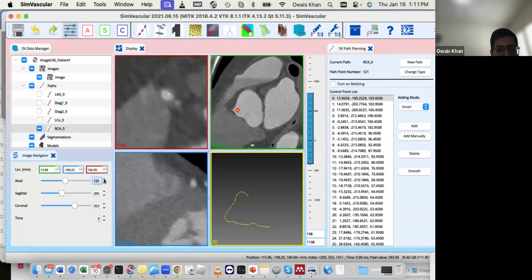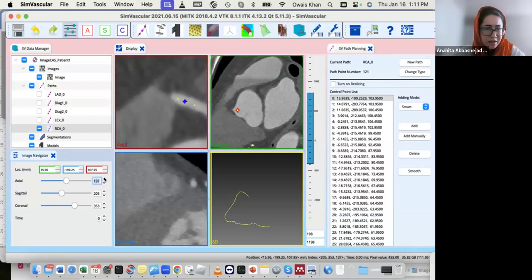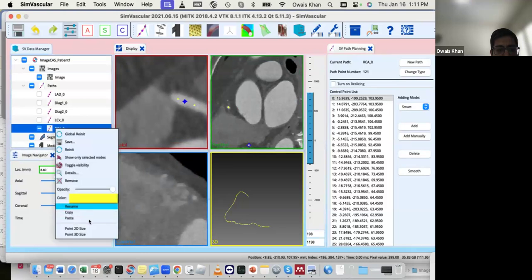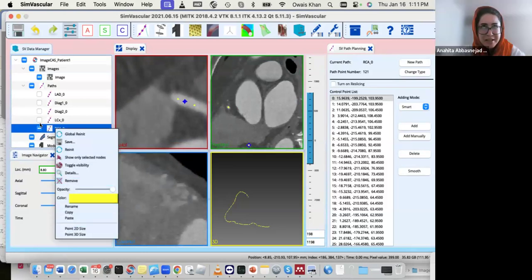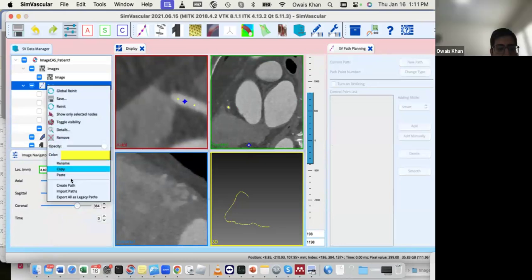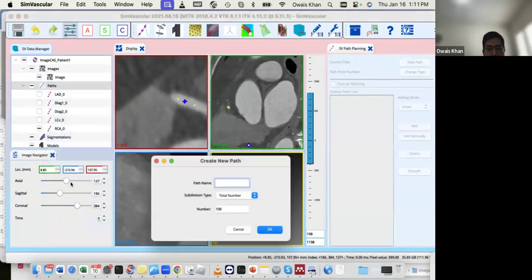I don't know what this is. And this is SN. Sorry, what's it called? I'm not sure about the name itself, but the abbreviation is SN. Okay. I think it's sinoatrial. So I'm going to call it an RCA1.